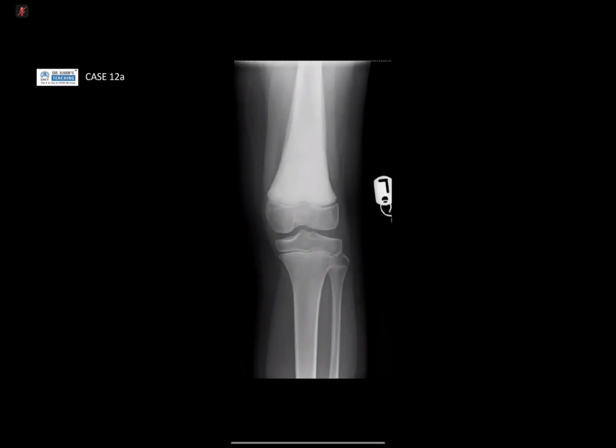So I'm given a frontal radiograph of the knee joint, with distal femur and proximal tibia visualized in a skeletally immature patient. I can see generalized sclerosis of the distal femur metadiaphyseal region with a band-like lucency running beneath the cortex, and sclerosis of the femur in the diaphyseal region. The rest of the epiphysis, tibia and fibula appear normal. Soft tissues appear normal to me.